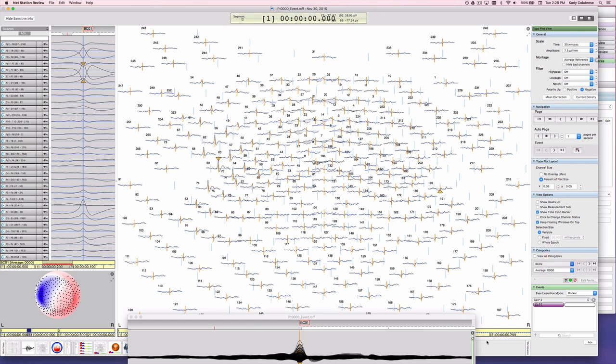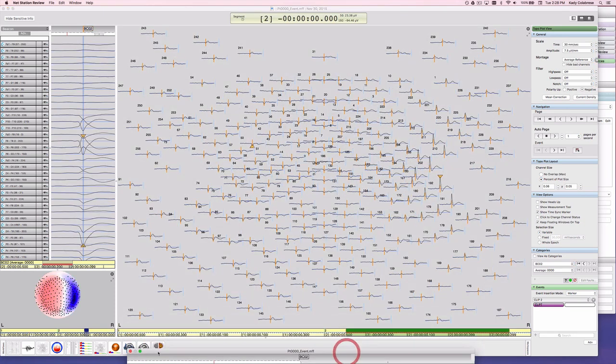Click on the Reciprocity Viewer icon again and choose your second imaging specification. You can choose up to 4 imaging specifications for each head model you've loaded. You can load up to 2 head models in the RVE for a total of 8 imaging specifications loaded at once. Choose a different head model. You could import a new head model, but I'm going to choose the 32-year-old male for my second head model.